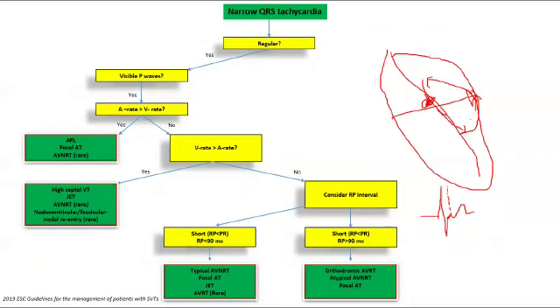So instead, your antegrade limb becomes your AV node, of which the impulses will then conduct down the normal conduction system, thereby giving you a narrow complex tachycardia, right? But because you have a bit of a bigger circuit compared to AVNRT, you have a longer RP interval, more than 90 milliseconds. Or you can have atypical AVNRT, or it might also be a focal atrial tachycardia.